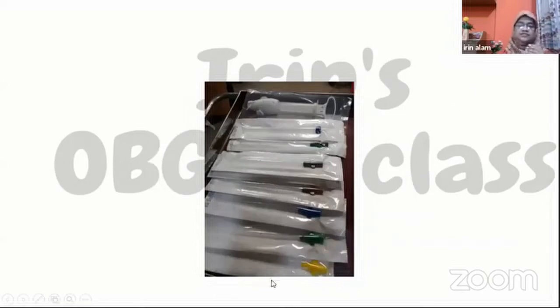These are the different sizes of MVA cannula. This is the MVA syringe. It is 60 ml capacity. It has two valves. And these are the different sizes of cannula. This is 4, 6, and according to size, the diameter will increase. And there are different colors for easy recognition.